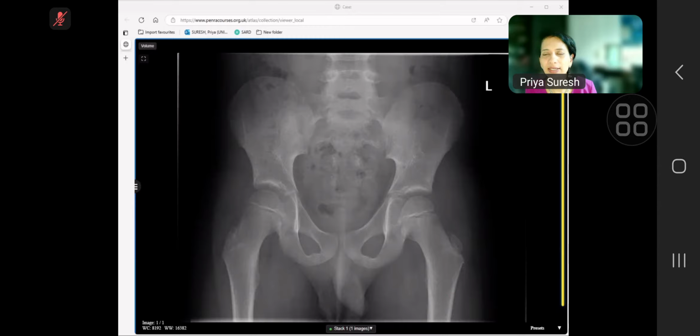Very nice nidus that was shown. And the nidus doesn't always have to have a focus of calcification. I think that's what you were saying: I see the nidus, I can see the hypodensity, but I can't see the calcification. It needn't have that all the time.